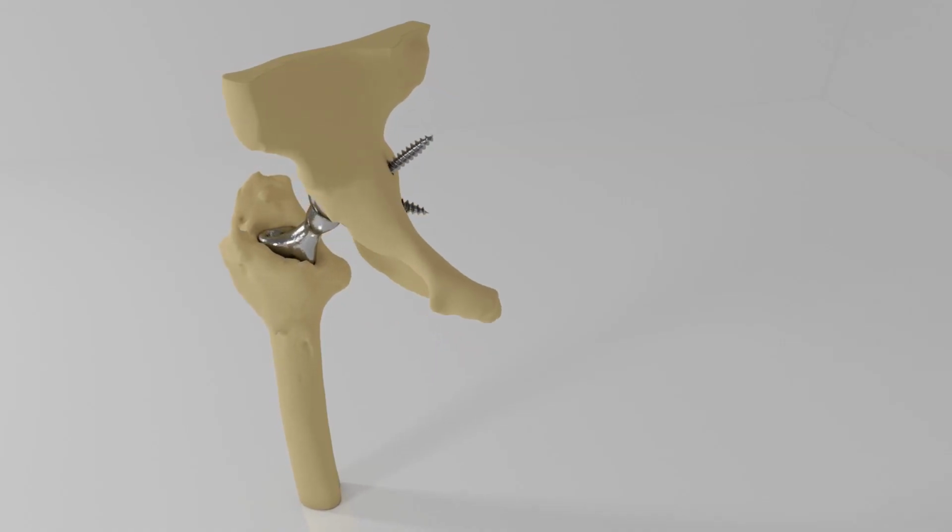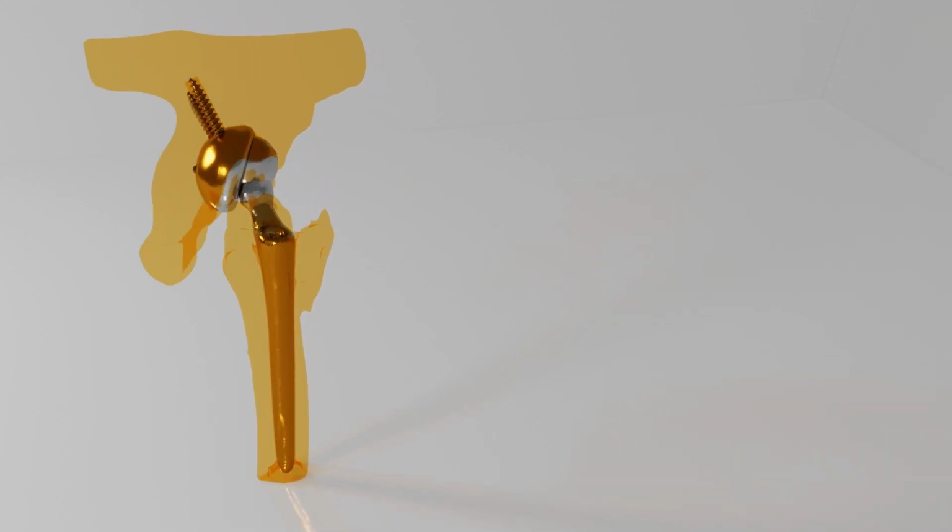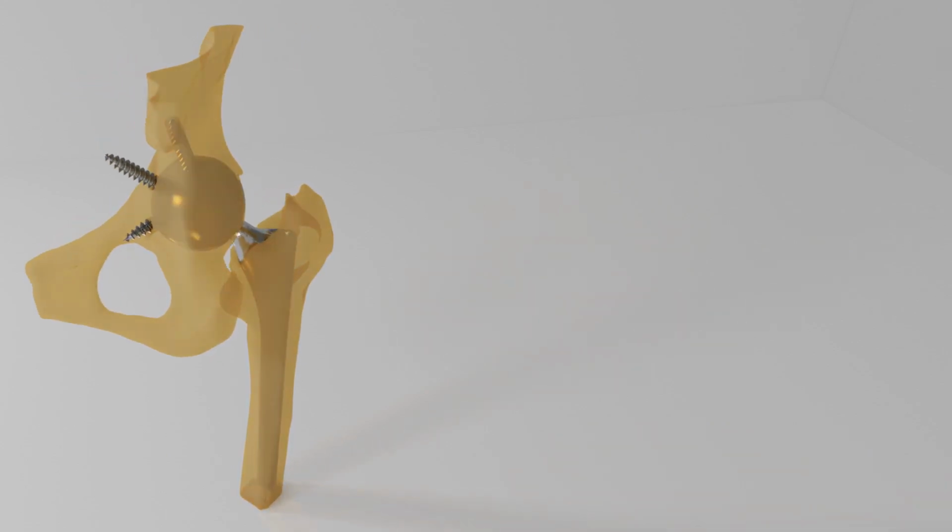Welcome to our first episode of HumanX medical case studies. In this video, we will explore how to create a customized model for patient-specific training.